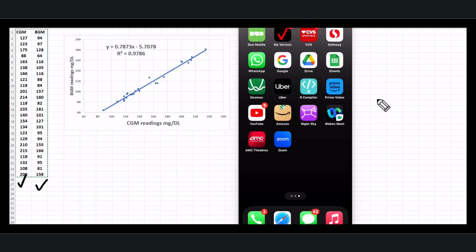So the way it works is that I save my data on a Google Sheet, because it can be easily stored on Google Drive, on which we have free access to a certain extent, a lot more than we need for this smaller data. Okay, so let me show you how we can handle that on a device like an iPhone, or if you have a different phone, then you can handle it differently.